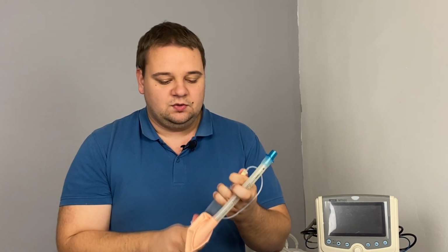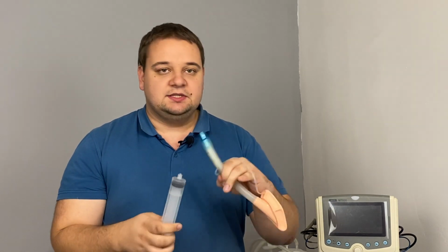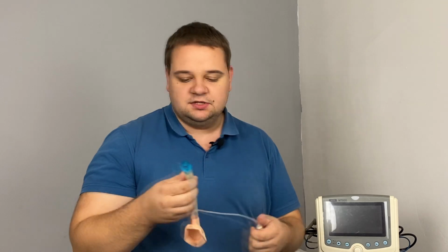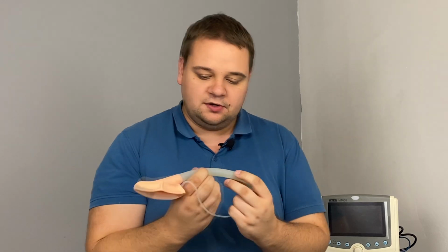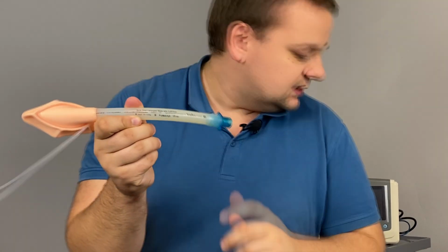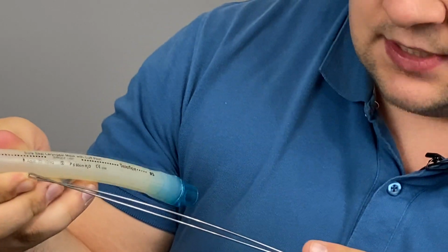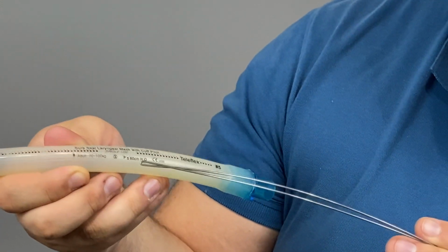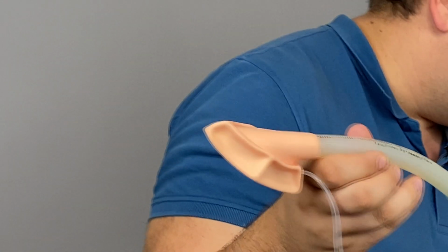When you use the tube, you will always have the information written, so it will generally say size number 5, like 100 plus kilograms and so on. So, about these devices. For example, I'm not sure if I'm able to show that on the camera generally. So it does say that it's a number 5, size 5 here, and it says that it's for adults for 70 to 100 kilograms. And this is the pressure that you create inside the cuff. More on that right now.